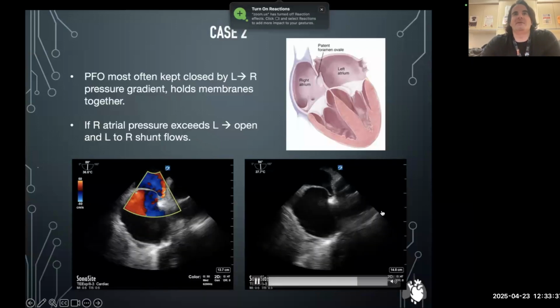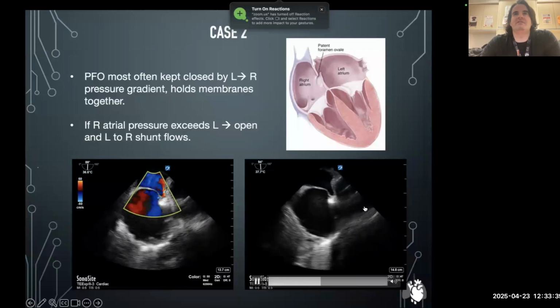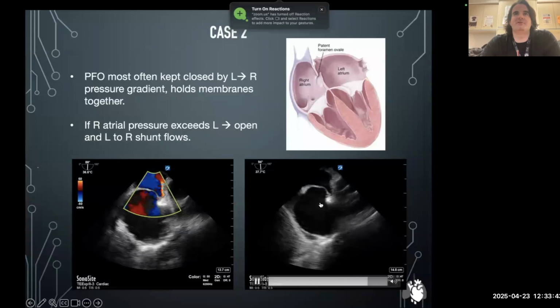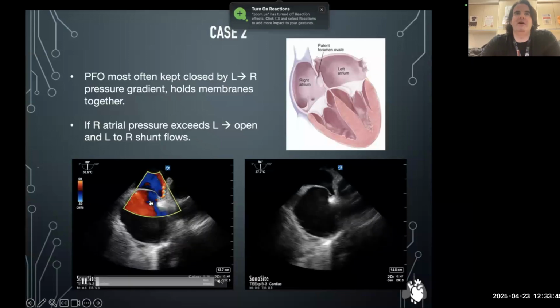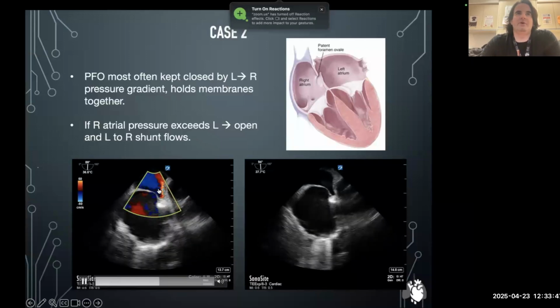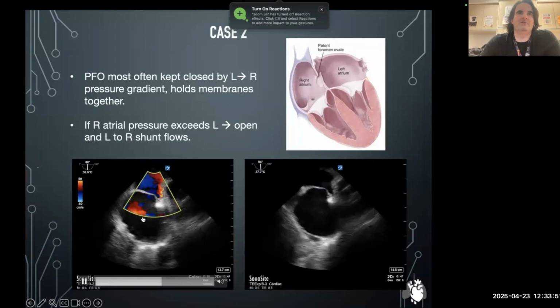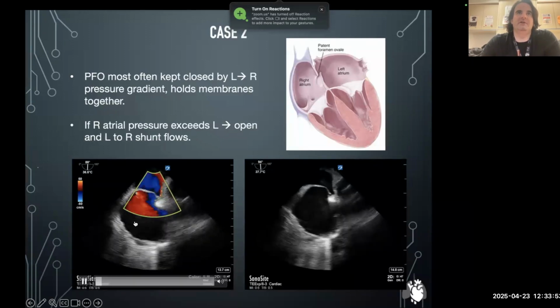I glossed over the anatomy here, but this is called the bicaval view. This is the SVC. The IVC is not well seen, but is there structurally. Right atrium, septum, left atrium. So yeah, you're seeing this here. Obviously, if this was the reverse way, you'd actually see the septum either flatten or bulge the other direction, and you'd see a shunt literally the opposite way.